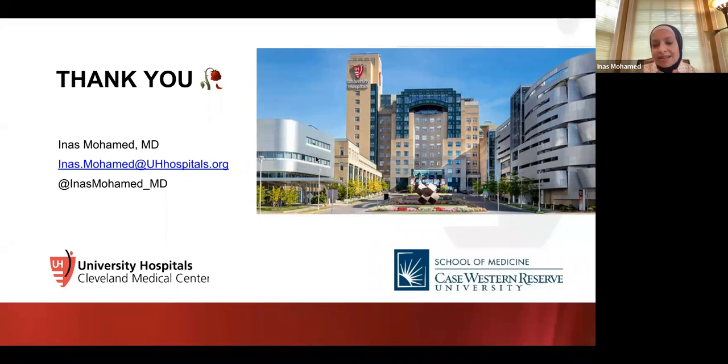The only other differential for fibrolamellar HCC would be focal nodular hyperplasia, but this looked too angry for focal nodular hyperplasia, with the calcification and all that. But yes, I would consider cholangiocarcinoma, but given everything around this case, my number one was fibrolamellar.